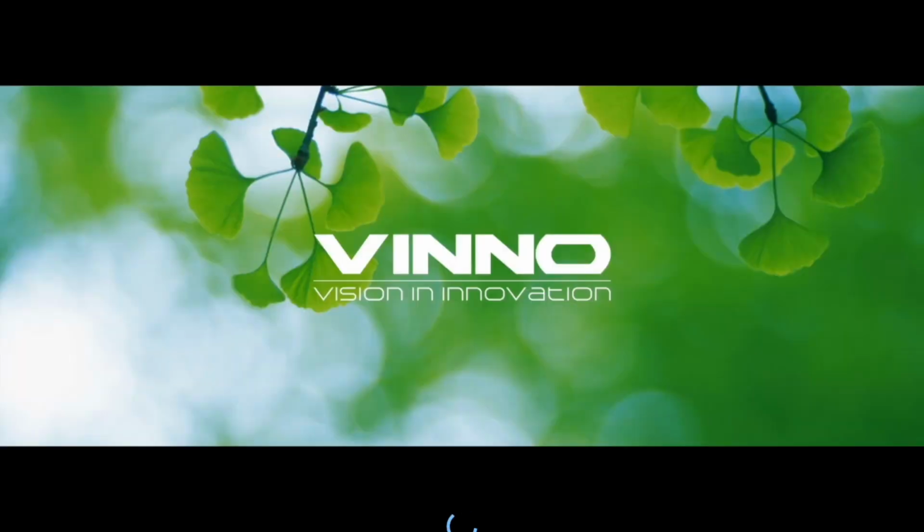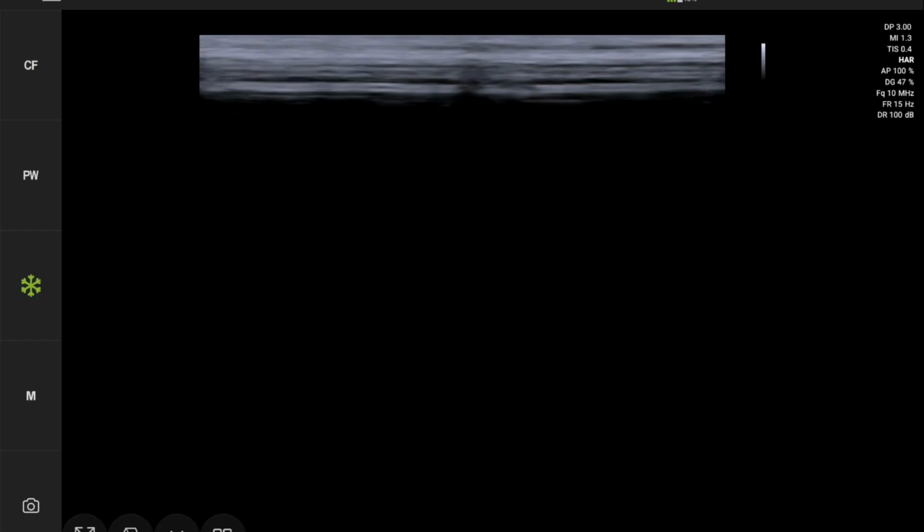Open the VINNO P app to start using your VINNO P series ultrasound. The app should automatically detect your ultrasound device, and you'll see that on the first page. You can either press that icon if you've never connected before, or if you have connected the device in the past, it will do it automatically for you. So let's take a quick look at the home screen.